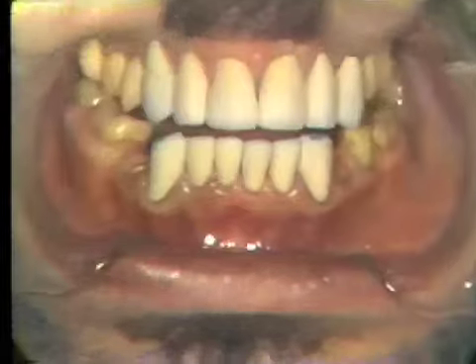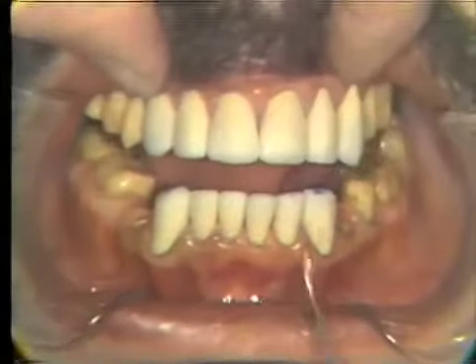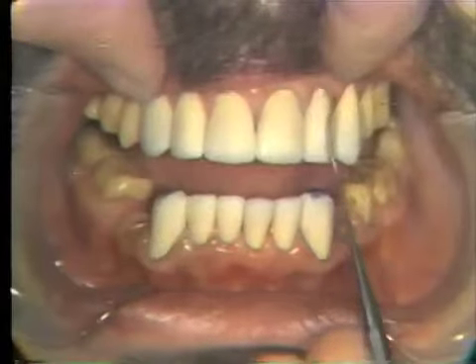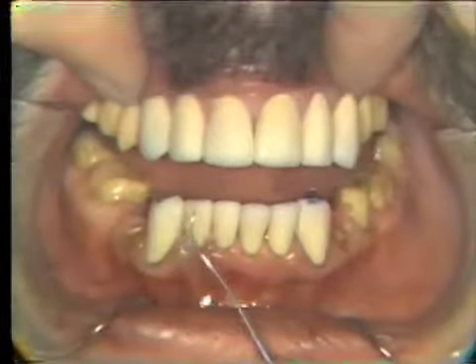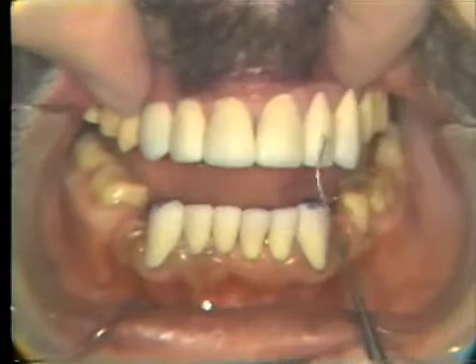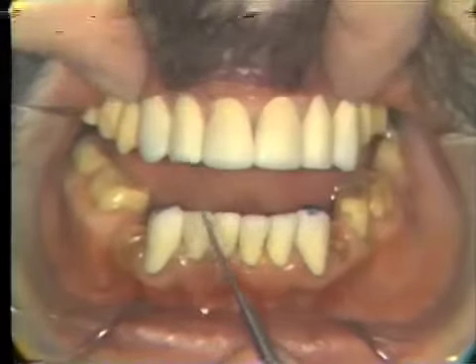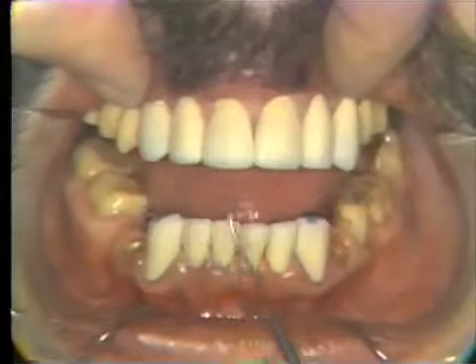Now the gingival areas of these restorations are, I think, fairly good. The concavities, there's not too much bulk in this area. The teeth have the masculine characteristics. You see that the lateral is more prominent in the male. The incisal edges are more of a rugged-looking appearance, square corners.